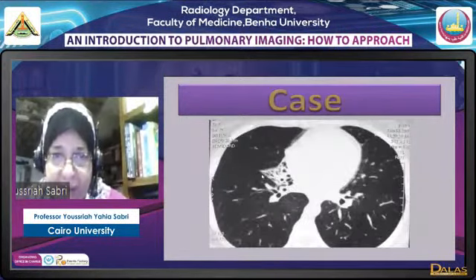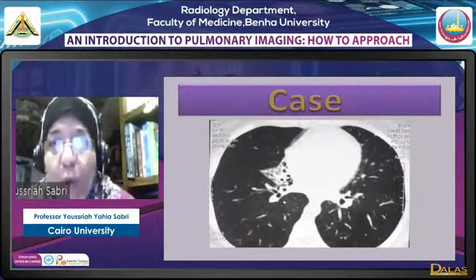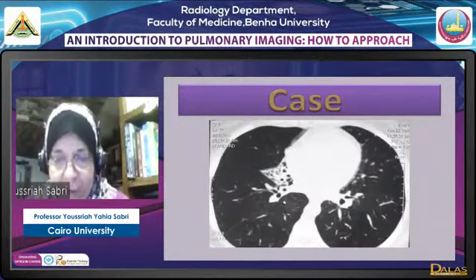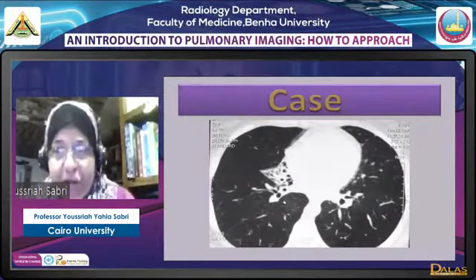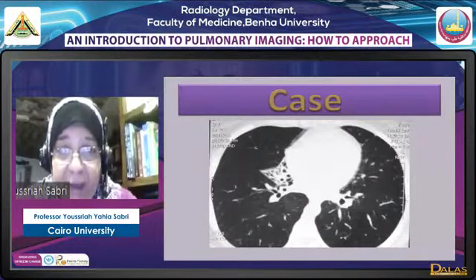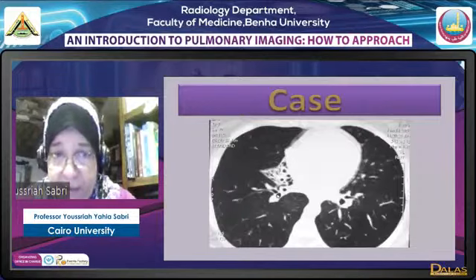Same appearance in this triangular lesion. Now, when a patchy opacity, whether fibrosis, consolidation or collapse, reaches a fissure, it becomes well demarcated by a linear or curvilinear appearance. So we have demarcation here by lines, meaning that we are dealing here with fissures.